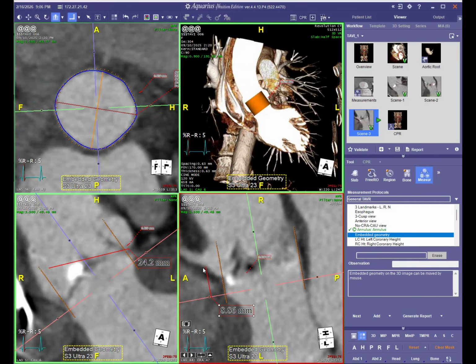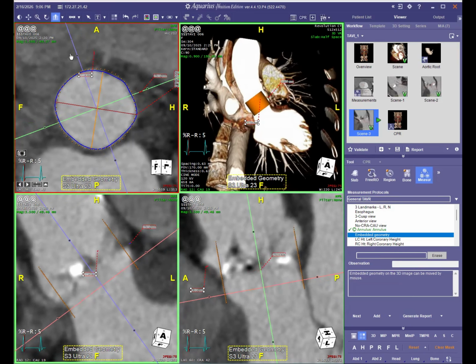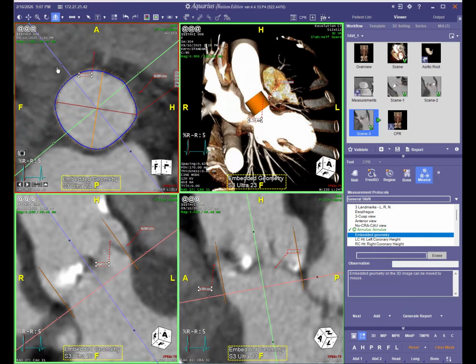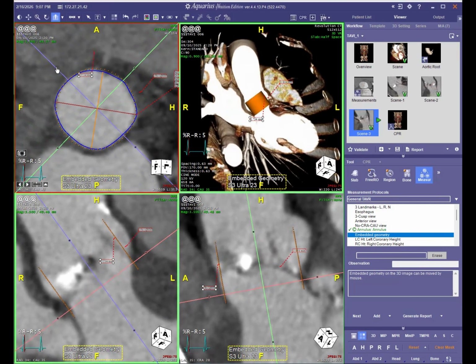And I'm going to leave a 3D marker. Again, minimizing this number because it doesn't mean anything. And now I'm going to try and rotate this purple line over to my right non-commissure. Watching over here. It's potentially up here.